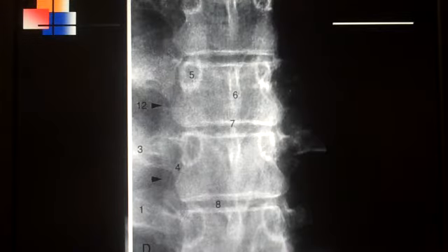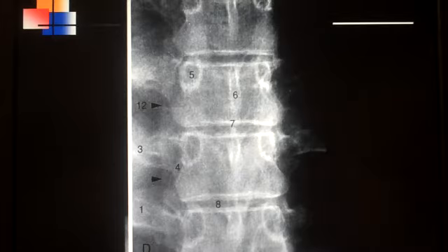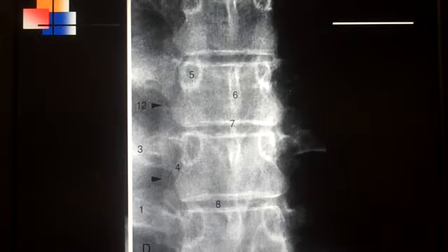There is another thoracic video that is going to be posted using a digital, but I wanted to go back and look at the one that we used in the classroom so that I could point out structures again and look at this one. This is the one from the textbook, and it is labeled, of course, the same way as in the textbook.